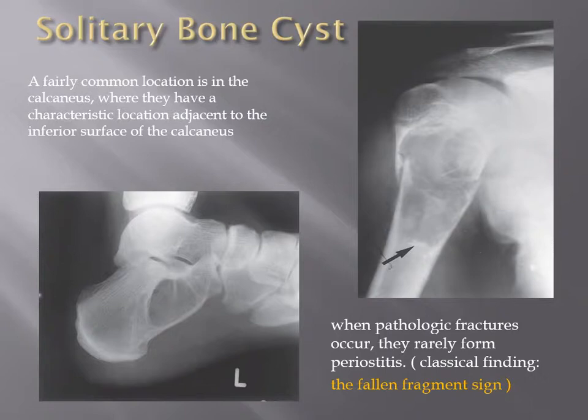And presented, the classical finding is the fallen fragment sign, and this indicates that the lesion inside is like a fluid or soft tissue component, so that the fragment will fall down.